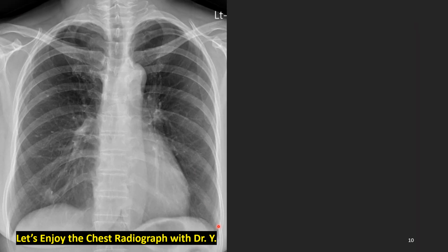This is a third case of a relatively young woman. She is a never smoker. What do we see? You got it? Yes, there is something conspicuous, maybe here or maybe not. Here, and the other field looks okay.